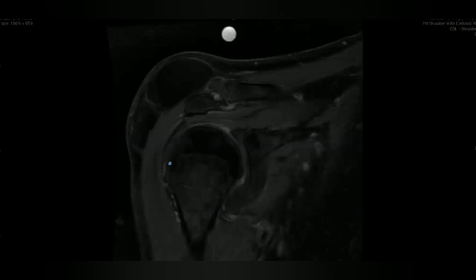Now, what obviously they did was they decided to give contrast to this patient to assess this lesion. But it is not showing any enhancement. If it showed enhancement, would you be able to differentiate between a lipoma and a liposarcoma? Yes, sir. Liposarcoma shows heterogeneous enhancement, irregular, infiltrating into the muscles. No, you're not listening to what I just said. Contrast does not help you differentiate between liposarcomas and lipomas. I have seen lipomas with variants demonstrating non-fatty areas, same level of enhancement.